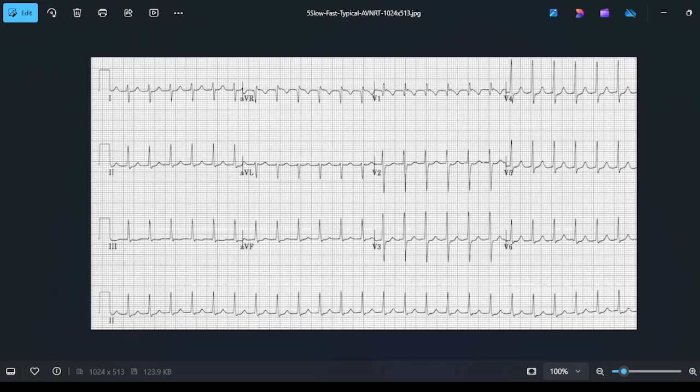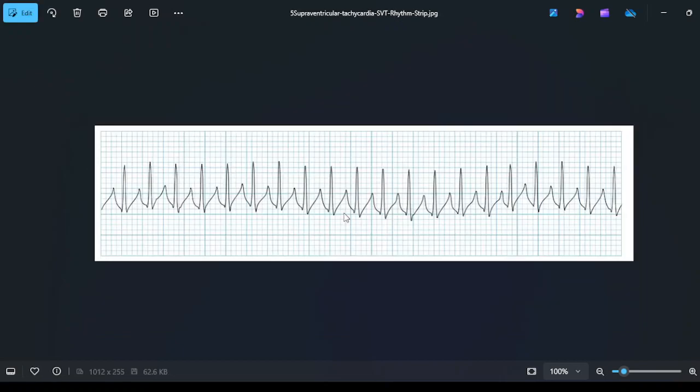Okay, so next, this is a zoomed-in picture. This one is a supraventricular tachycardia. Can you see a P wave anywhere? No, right? So the distance here is 3 squares and 5, so in total one big block is the distance between two QRS complexes. Two R waves are one big block and a little more, like 6 small blocks. Okay, and there is no P wave.